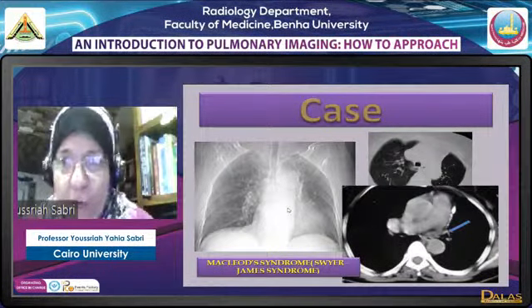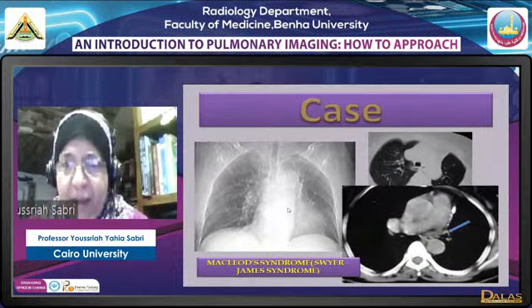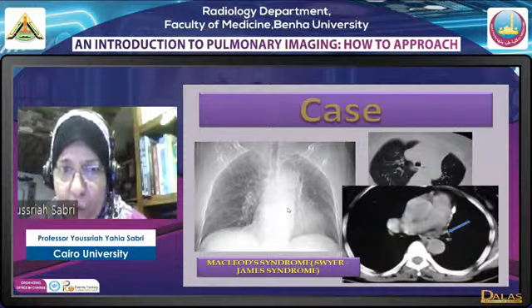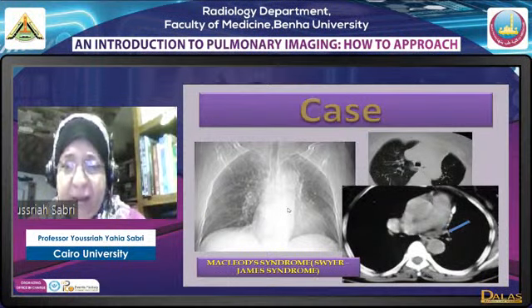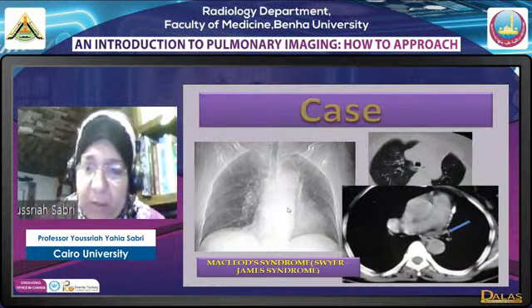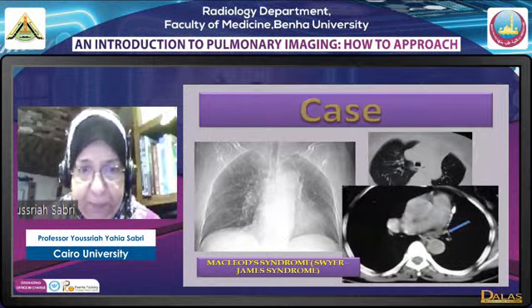What is this? Well, it's not a congenital condition. It's a patient who, very early in life, had a severe unilateral chest infection or bronchiolitis, okay, and then the lung became smaller later on, with a small vessel supplying it because it's not functioning properly.